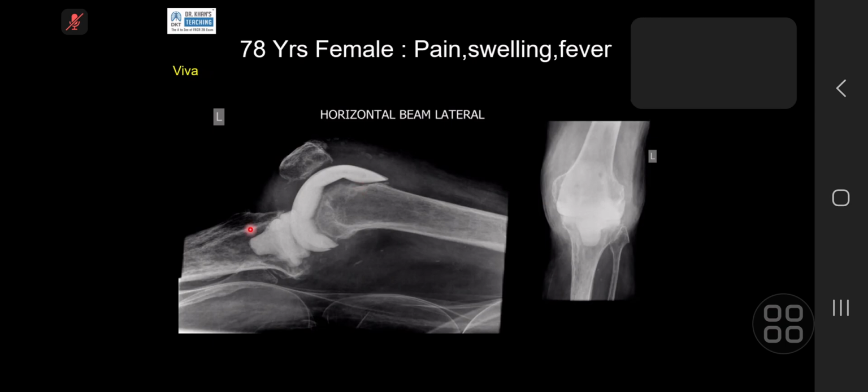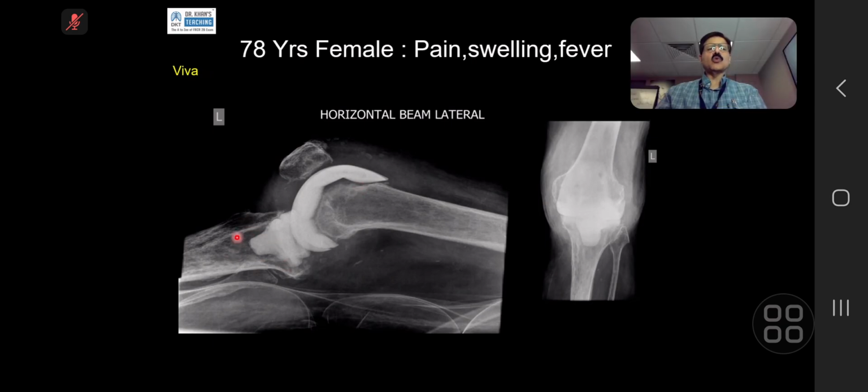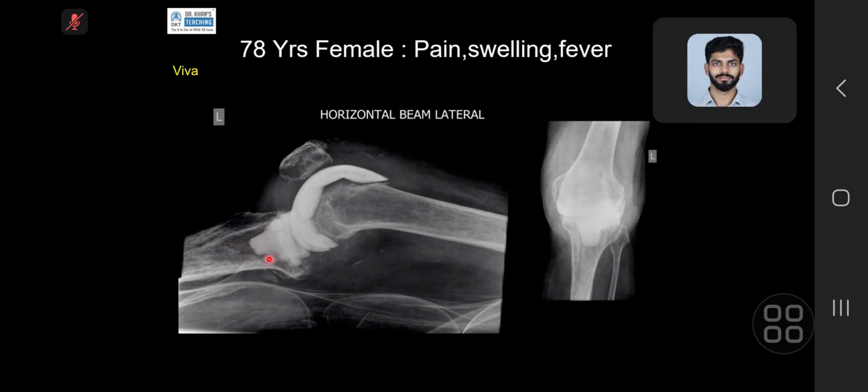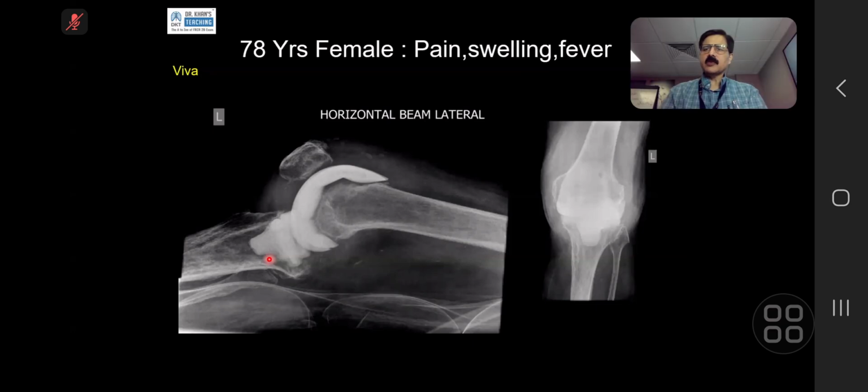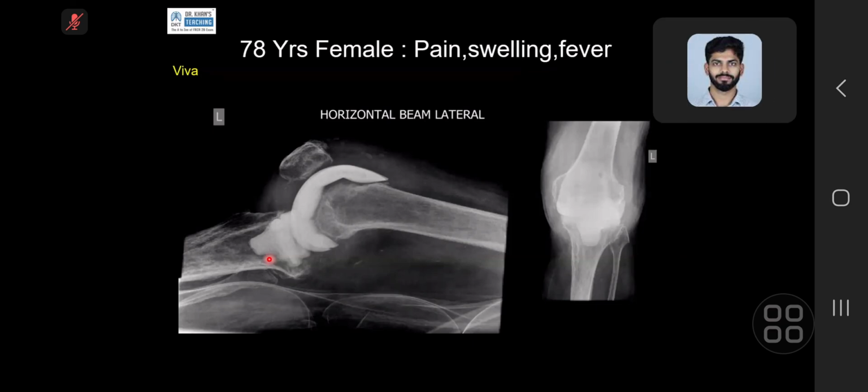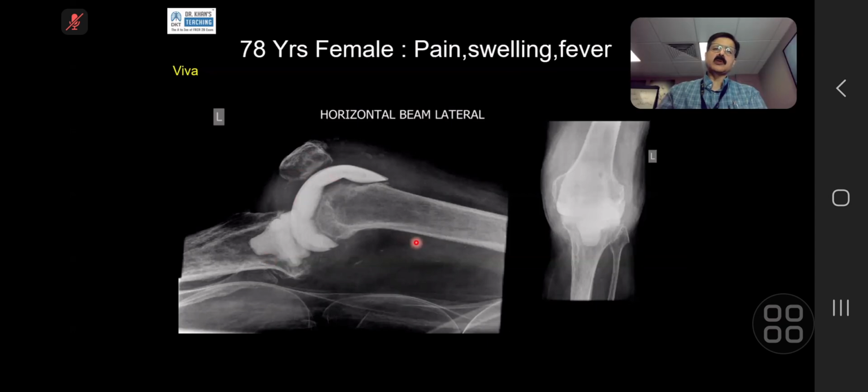Proximal tibia here. Yes, sir. So don't worry, this is all a bit of osteopenia, etc. Don't worry about the tibia. Okay. Other than that, I can see lytic areas involving the patella. Sorry, say again. Which part? Patella. Okay, so this is also osteopenia. Don't worry about this. What else?